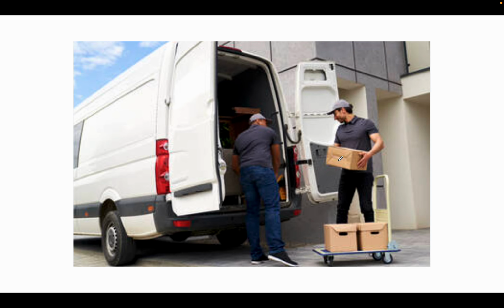He's passing the boxes at a certain rate, and this person here, with each box, gets really tired. Eventually he gets so tired that he drops one of the boxes, which is that dropped P wave, but then the next box that this person is ready to pass on, he'll be ready to collect. So that's an analogy if anyone finds them useful.